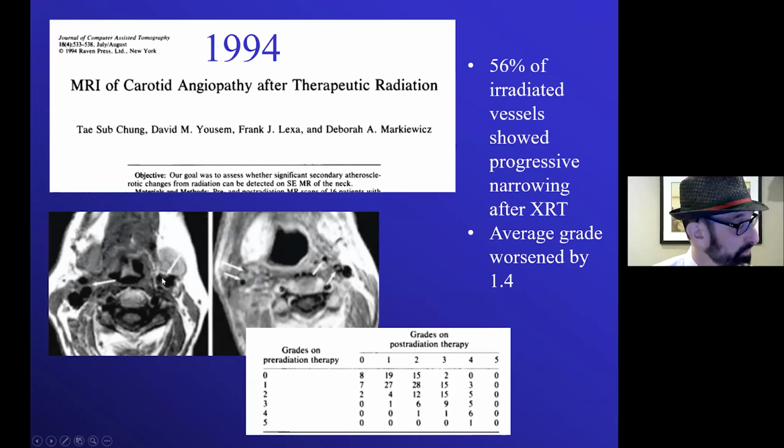Here's the vessel pre-radiation. Here's the vessel post-radiation, and there were areas of narrowing. So radiation vasculopathy, both intracranially, where you may see narrowing, and as I mentioned, it may be the source of Moyamoya syndrome, not disease, but syndrome, affecting the blood vessels. And that may be unilateral or bilateral, frankly.